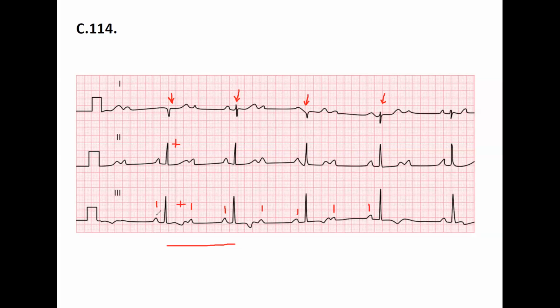No, it's not an odd ratio, it's just a ratio. It looks like, again, every second beat is conducted in a P wave, yes? Yeah, I thought maybe an AV block, the same as Zoe. Yes, that's it. AV block, 2 to 1 AV block.